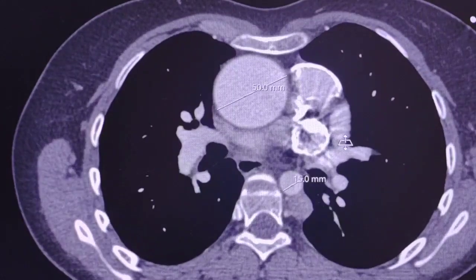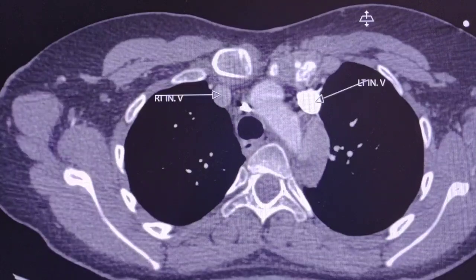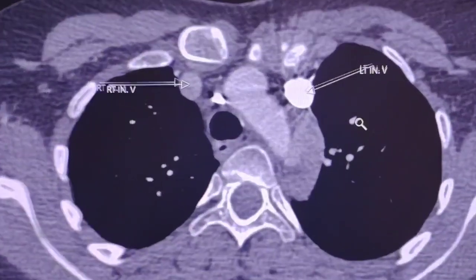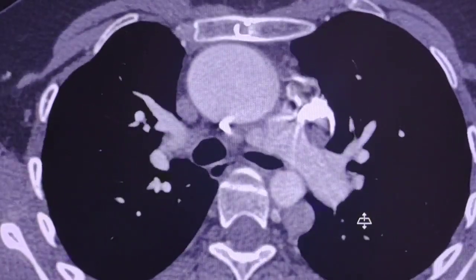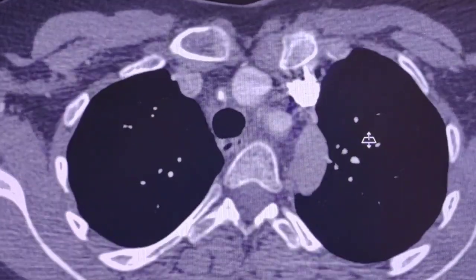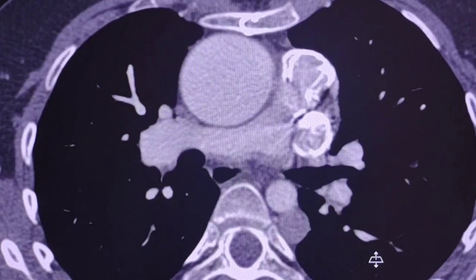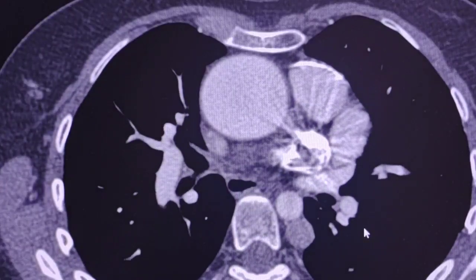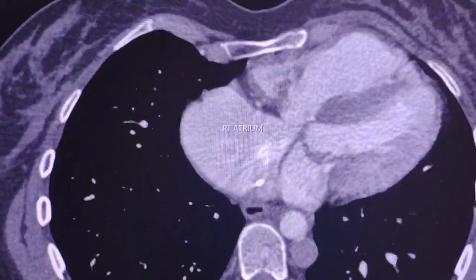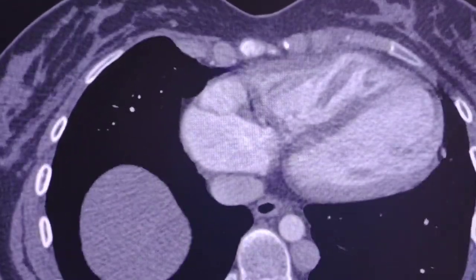But apart from this, I would like to show you some anatomical changes related to Tetralogy of Fallot, and let's see some of them. I will scroll the images up and down to have your first impression. And then I will explain you the abnormalities, the anatomical abnormalities.